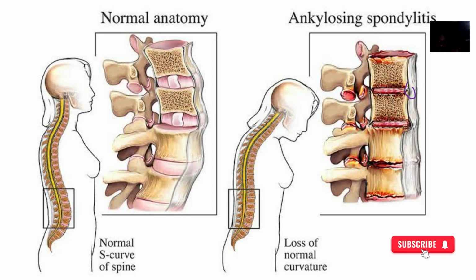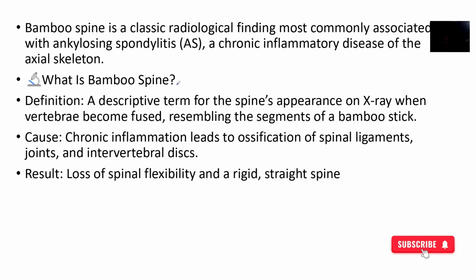It seems to have partitions, but not clear partitions like a normal spinal tract we have. You understand? The partitions are very, very small. So when we say you are having a bamboo spine, it simply means the clear partitions between two vertebrae on the spine are actually being reduced to form some very, very little demarcations.